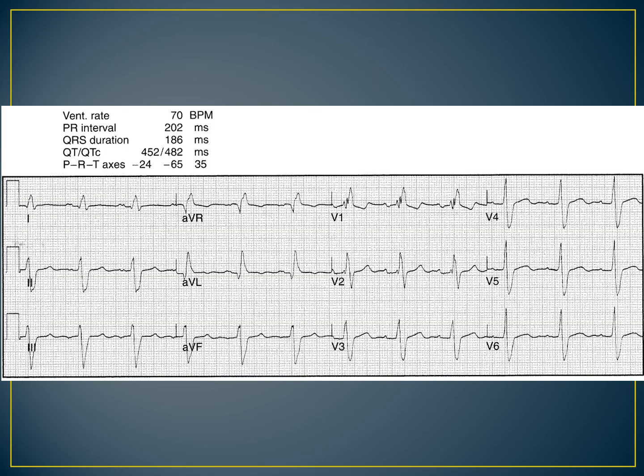Now, what's the QRS interval on this one? Is it wide? It is. The QRS interval is 186 milliseconds or 0.19 seconds. So now what? You're going to go to V1 and find the J point. What direction are you shading in? If you said upright, you're correct. So what bundle branch block is present? If you said a right bundle branch block, then you're correct.